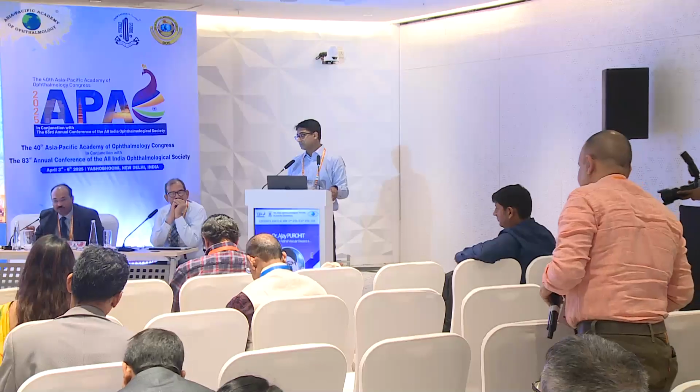Yeah, this is something we touched upon earlier. Manual segmentation is very important. The moment the edema sets in and there's a lot of distortion, especially with a lot of intraretinal fluid causing sideways lateral distortion, it's not easy. But at the same time, it has been seen in the literature that when it's excessive, let's say 2 standard deviations beyond what it should be, then your outcome may be a little poorer.